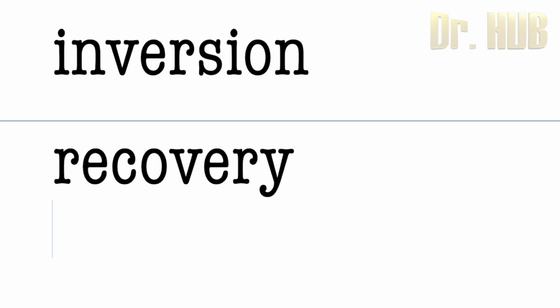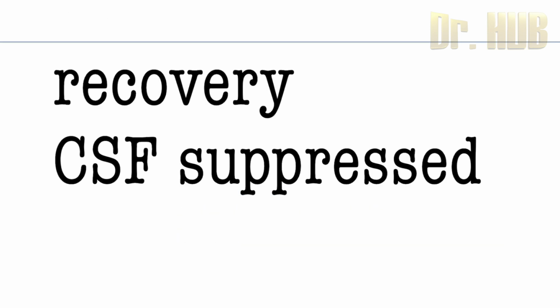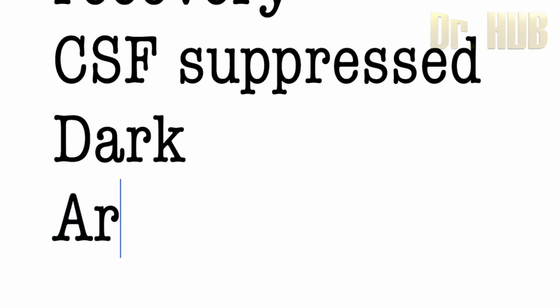And looking at the CSF, it gets suppressed and it becomes dark. That is in case of the arachnoid cyst.